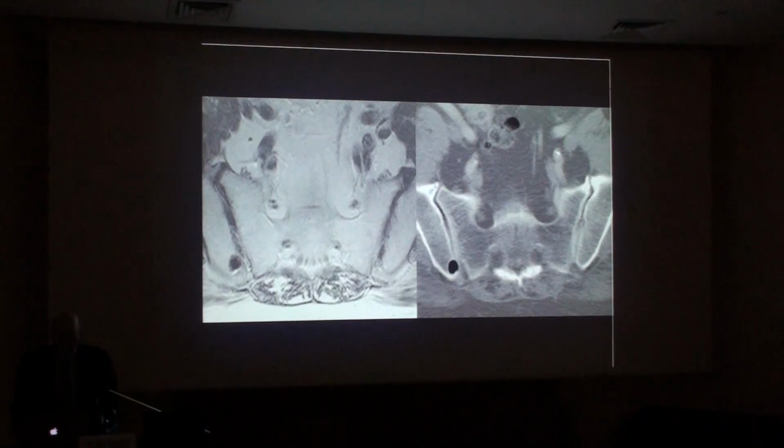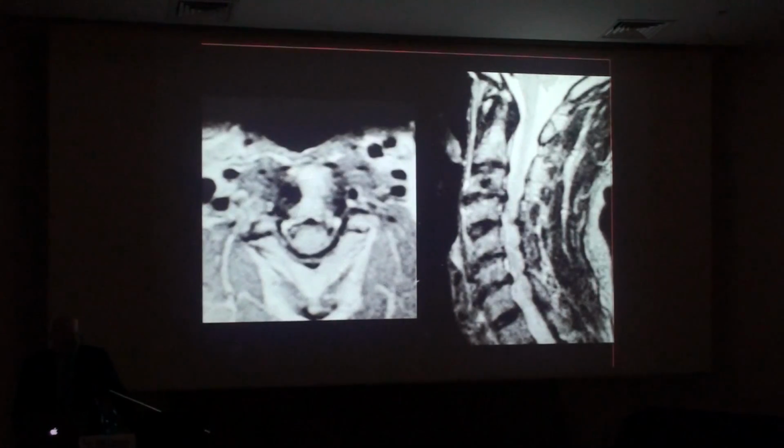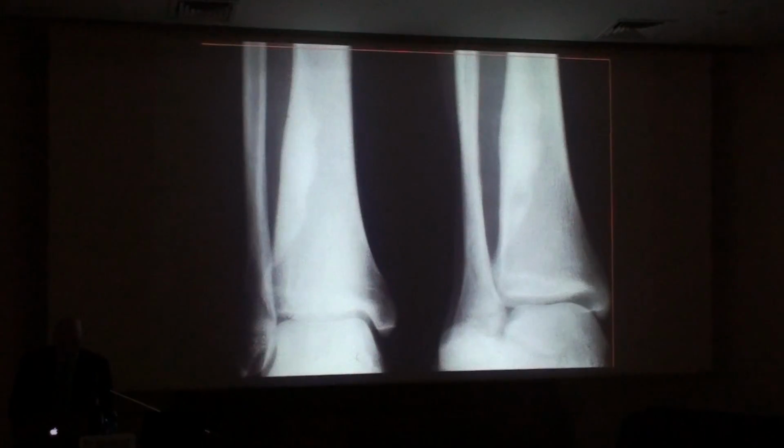metastasis, but let me show you this case of a patient who was referred in for blastic metastasis of the spine, presenting with neck pain shortly after his diagnosis of prostate cancer. And of course, CT very nicely shows the extensive degenerative disease, and of course the pneumatocyst was mistaken as a bone metastasis. Now, not all things that are blastic are bone islands.